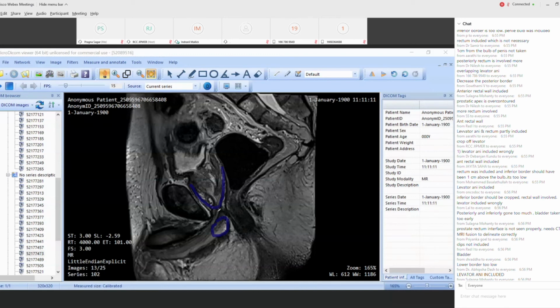Okay. So this is the urogenital diaphragm in between. Okay, I hope that it made sense.